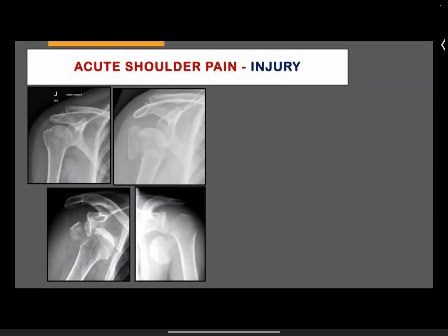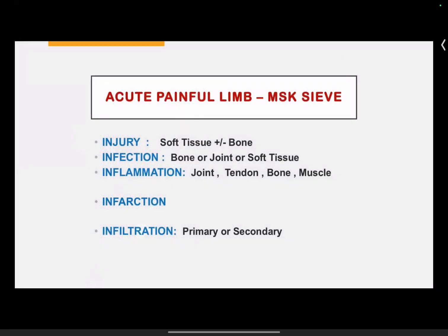So that was it, let's just go back. All right, so just keep that in mind. Let's see if I can hammer these points home again by moving into the upper limb now.